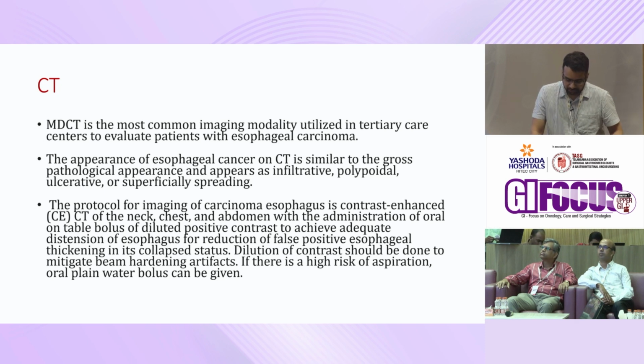And the dilution of the contrast should be done to mitigate beam hardening artifact. If we don't dilute, there will be a lot of artifacts coming from the contrast, which obscure the lesion. And if there is a high risk of aspiration, an oral plain water bolus can be given.